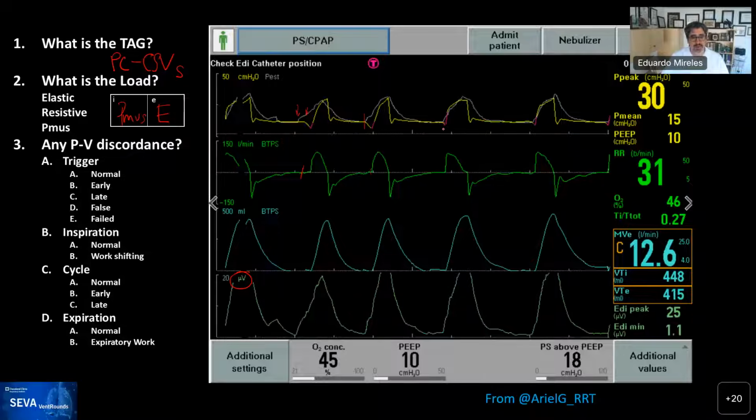So if you just look down, you can see it's not the same shape as the EDI, but it's very similar. Yes, because it's adjusted. So let's just coordinate on this. Would you agree that if the shape is proportional to the shape down below, and starts at the same time as the signal down below, that would be correct? That's correct. It's just that it's simulated pressure. It's not actually the EDI signal.